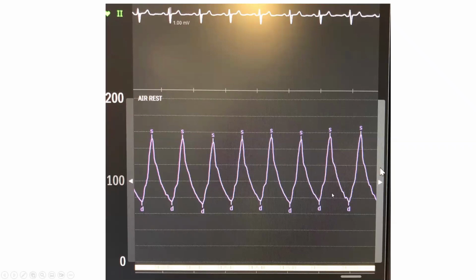There is something unusual though. When you have severe AS, you get pulsus tardus, that delayed peaking with low lying anacrotic notch. But you also get pulsus parvus, meaning a narrow pulse pressure from the narrow stroke volume. This is a wide pulse pressure. The pressure here is around 155/75. So how come you have wide pulse pressure with this AS?